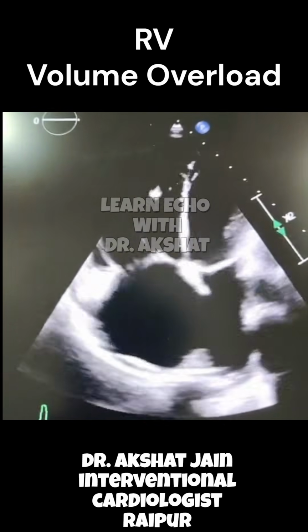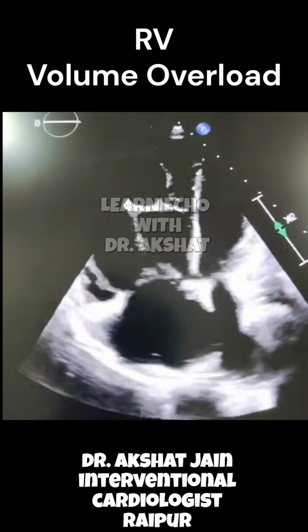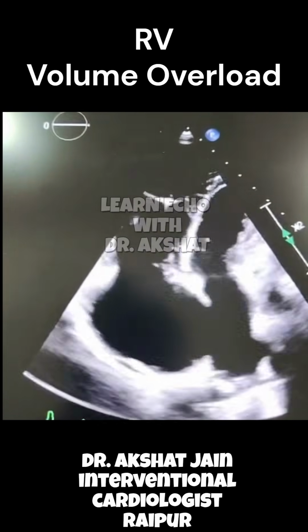So this is very important. A D-shaped LV, or the compression of the septum into the LV happening during systole, suggests RV pressure overload, and if it is happening only during diastole, it suggests RV volume overload.